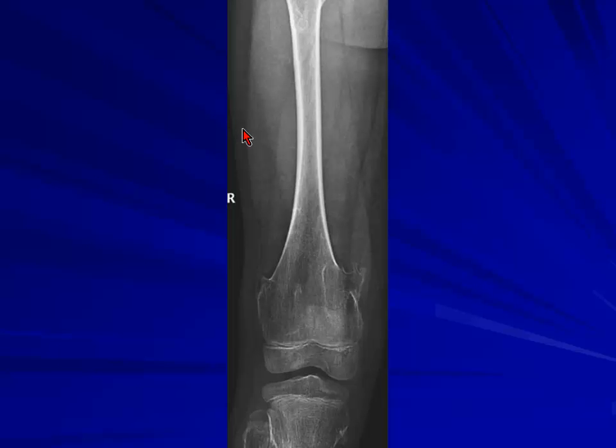What is this? Which is exostosis. And what's that? Yeah, so it's enchondroma, and this is exostosis, and these are multiple. You've got one here and one there, and maybe this may have a syndrome, or this could be an exostosis because of the projection, so it's all lying. If you do a lateral, you may see an excrescence coming out.